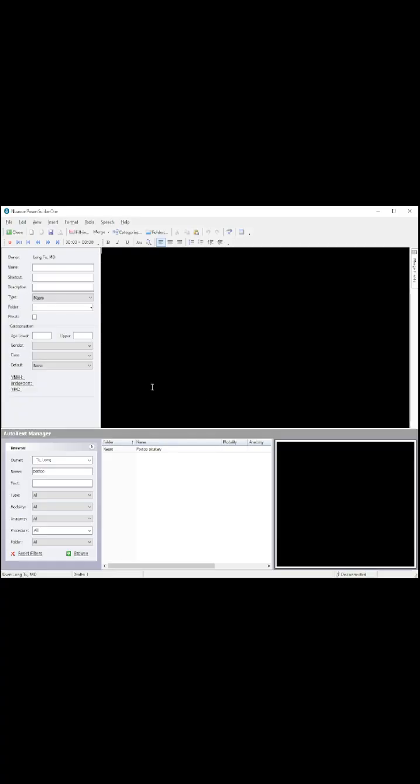So let's just say I want to make a new macro. Not only do I want these lines, I want the whole template of what I want, so I could just input this into a report. If I open up an MRI of the brain or a CT and I see postoperative changes at the pituitary gland, I can input that. But what I could do is have a template that is just for the assessment and includes all of the pertinent negatives.